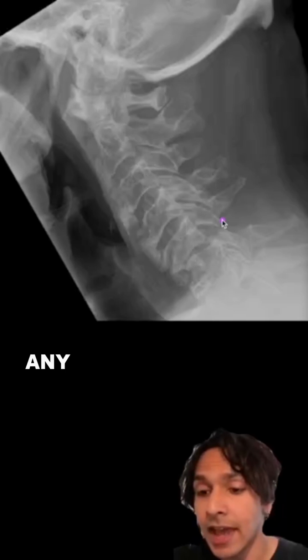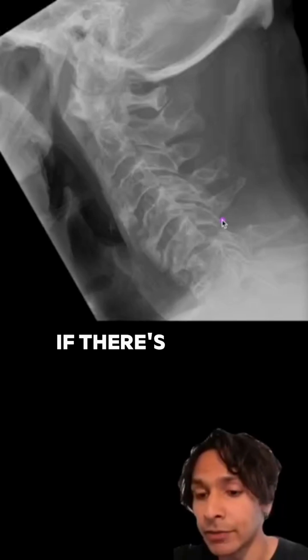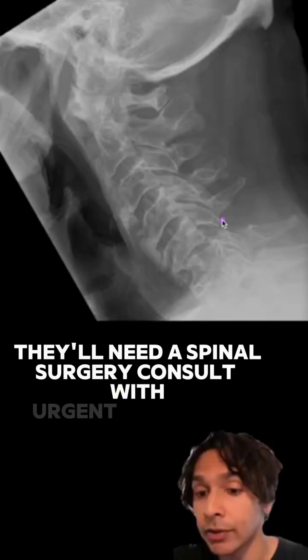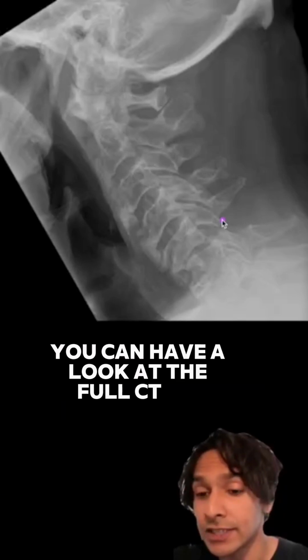bilateral involvement, any fractures, and also potential MRI if there's any neurological deficits to look for injury to the cord. They'll need a spinal surgery consult with urgent reduction. You can have a look at the full CT at radcases.net.